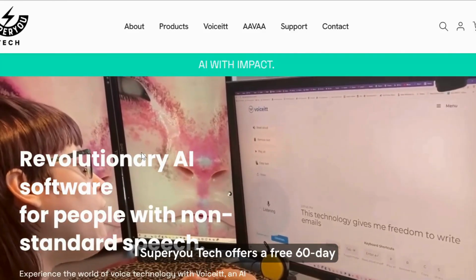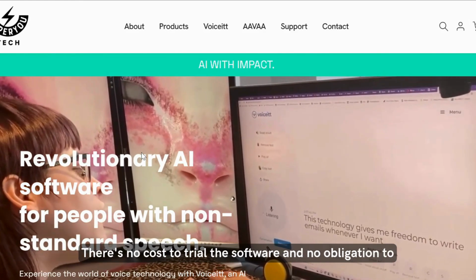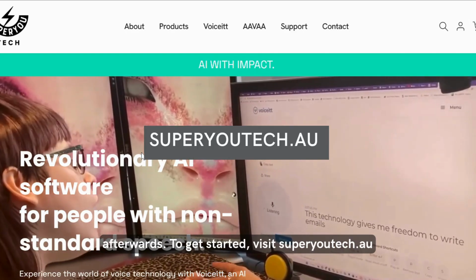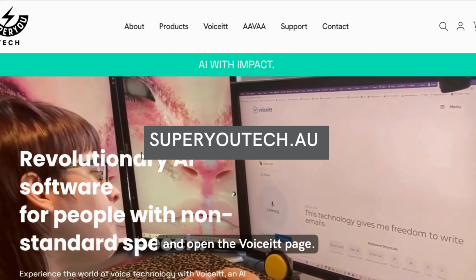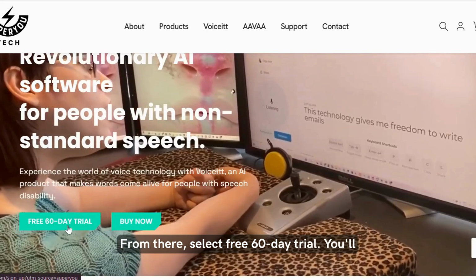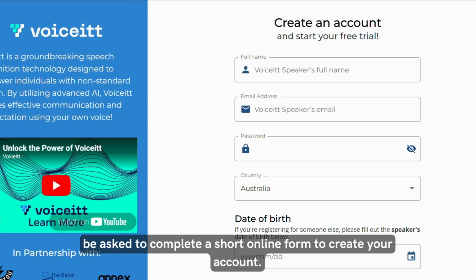Superyou Tech offers a free 60-day Voiceitt trial for people in Australia. There's no cost to trial the software and no obligation to continue afterwards. To get started, visit superyoutech.au and open the Voiceitt page. From there, select Free 60-Day Trial. You'll be asked to complete a short online form to create your account.